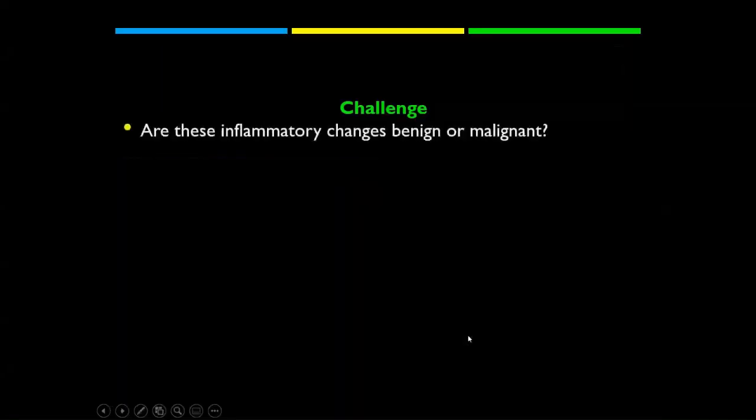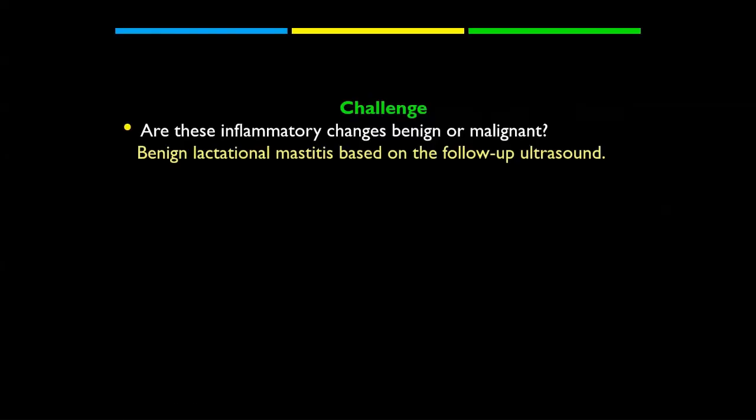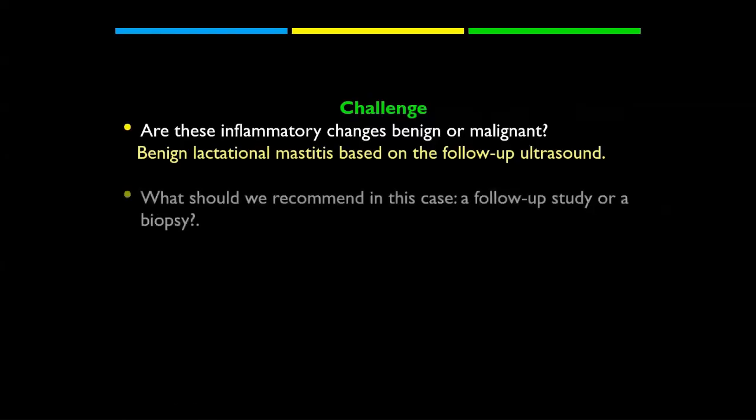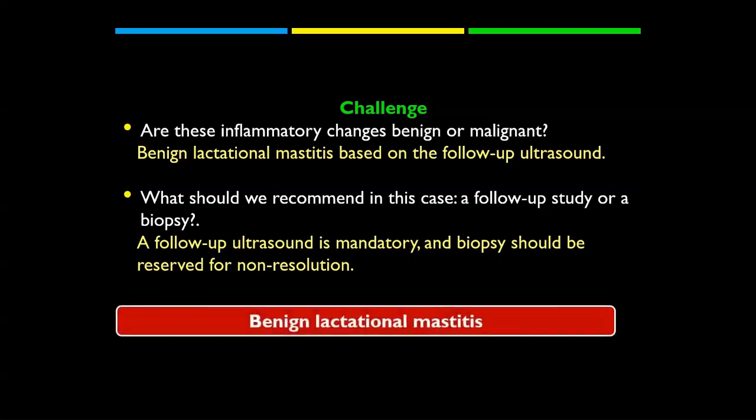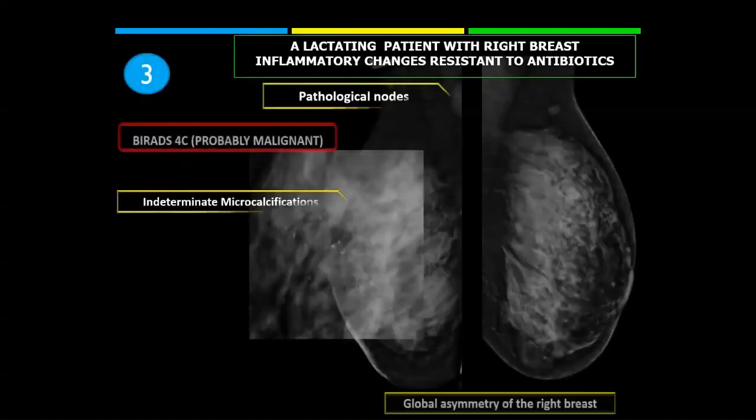So the challenge in this case, are these inflammatory changes benign or malignant? We cannot say based on the first examination. We can only confirm it is benign based on the follow-up ultrasound examination. And what should we recommend? As we said, we should give her a short course of antibiotics. Non-resolution after 10 days is an indication for biopsy. And this was a case of benign lactational mastitis.